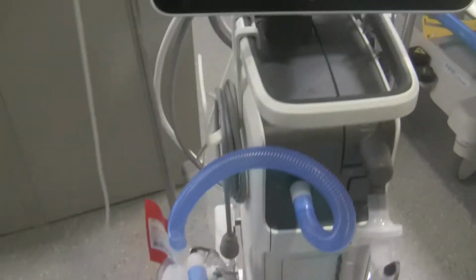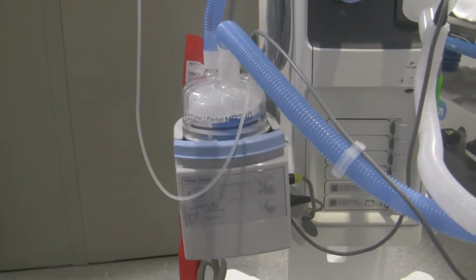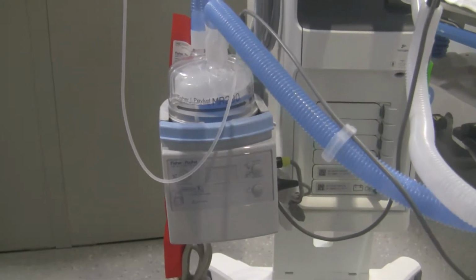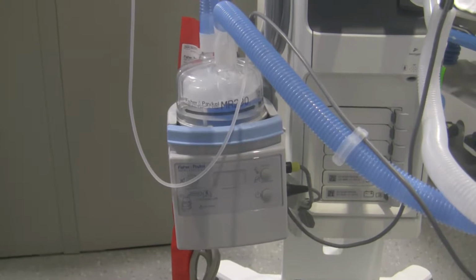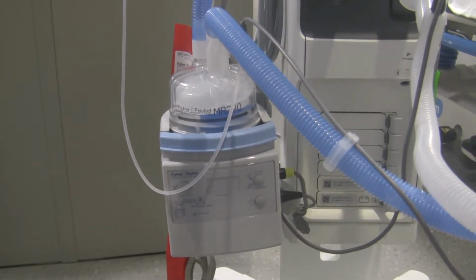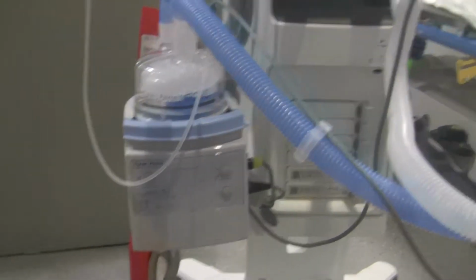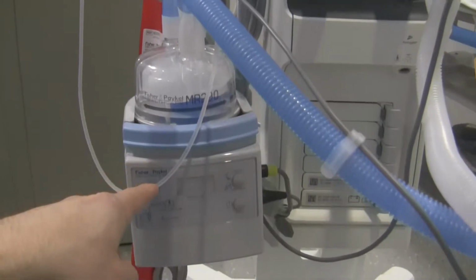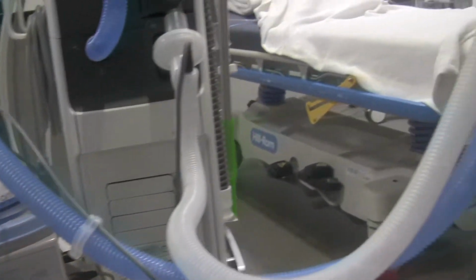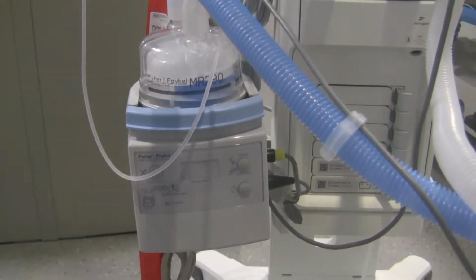Now, most ventilators will have a humidifier. The humidifier is specifically used to heat the gases as they go to the patient so that you don't have a deepening of the isothermic saturation boundary point inside your lungs. The gas has to be completely humidified, since the gas going into the patient's lungs is not going to have any moisture inside of it. So when it comes out of the ventilator right over here and travels to the patient, it should go through a humidifier prior to reaching your patient so that you don't cause any drying of your patient's airways.